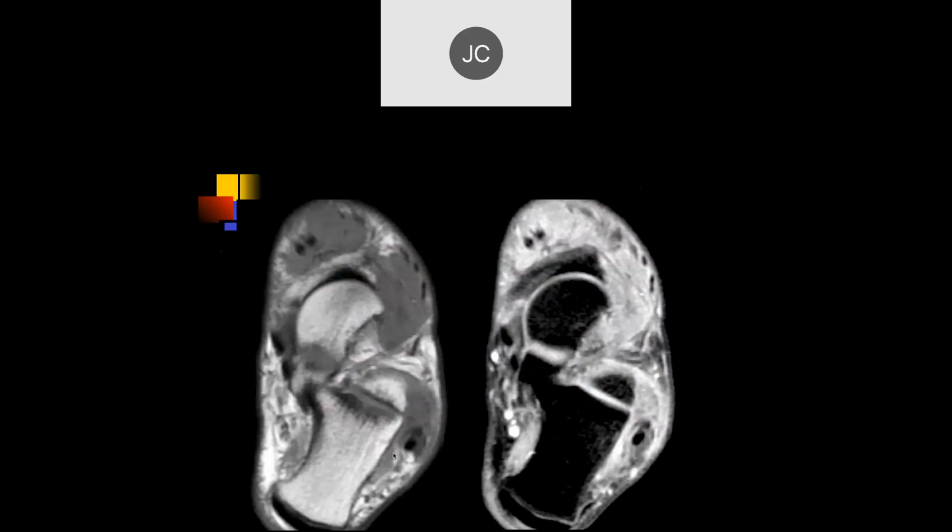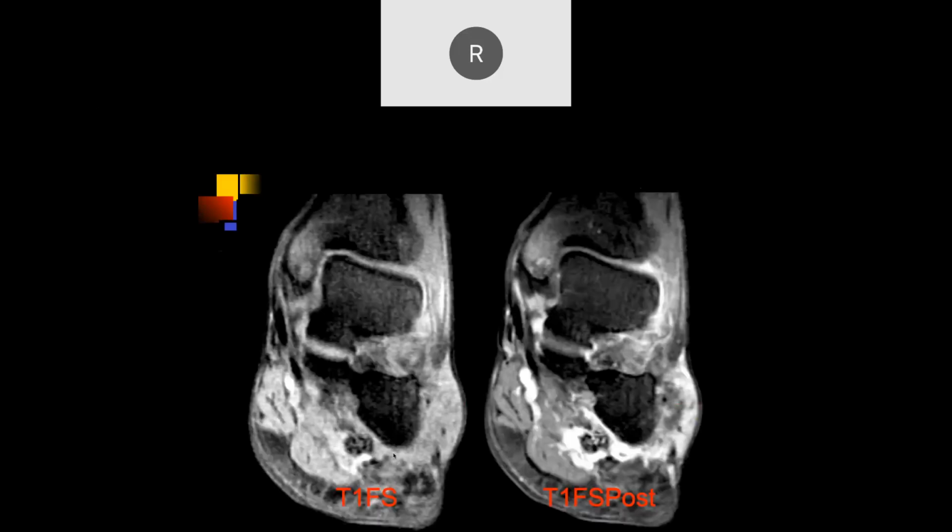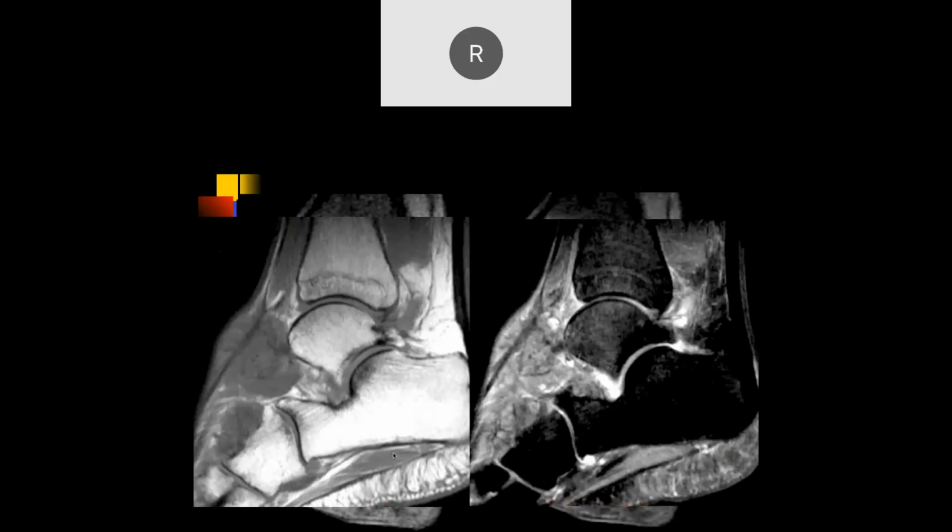All right, so looking at the ankle here. Yeah, looks like there's some soft tissue there. Again, anterior lateral aspect of the ankle looks like there's some heterogeneously enhancing soft tissue there, and anterior looks like there's a lot of soft tissue there. So again, I'd be concerned for gout. Right, good. And that's all gout, tophus formation.